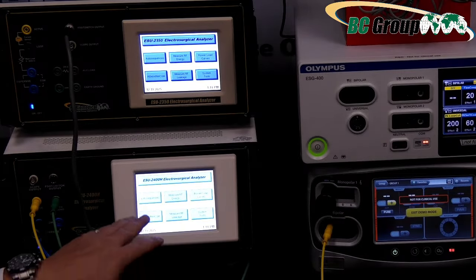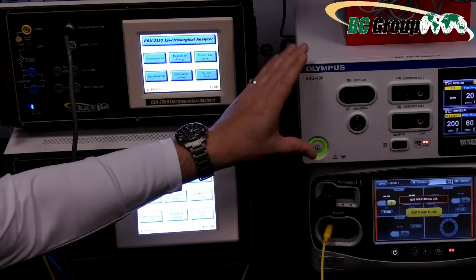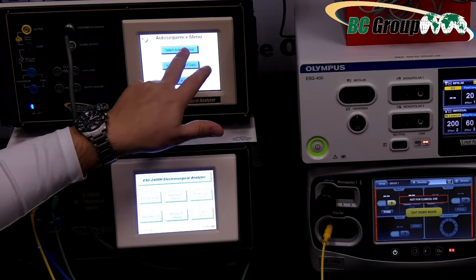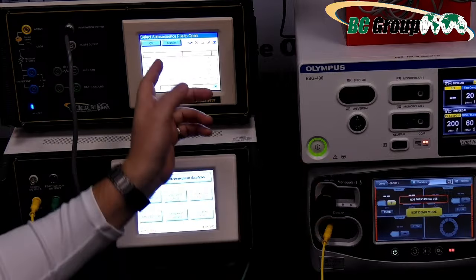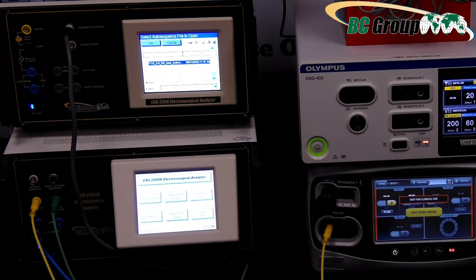Okay, so on the main screens we have auto sequences. That means you click this guy here, and we have sequences built in for most of these already. All you have to do is go into the menu, find the auto sequence that you want, and select it. Like this guy here is an FT10. We can load the FT10 menu. Okay. And it's going to load the sequence, which is going to walk you step by step through a PM.